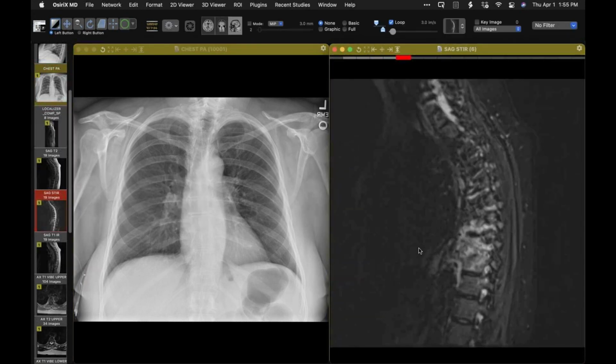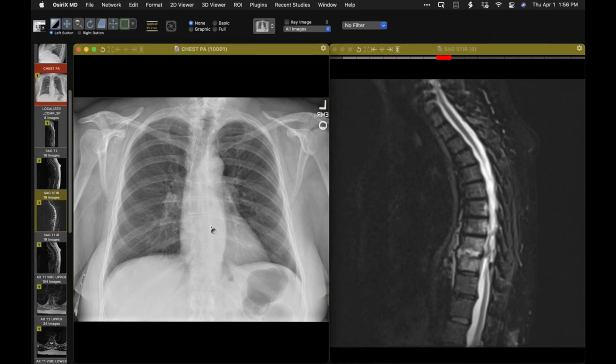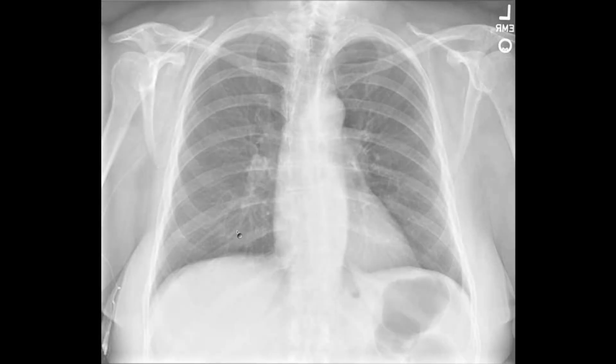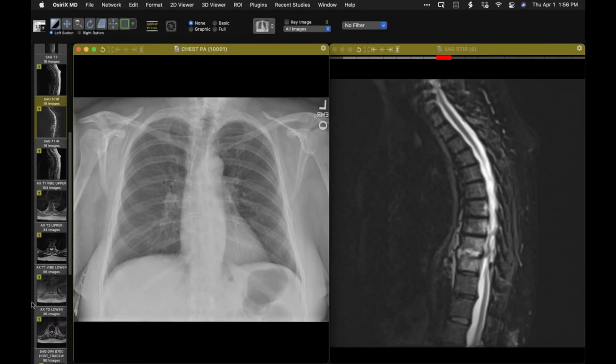And here you can see some of the MR, the abnormality consistent with a discitis at that level and paravertebral soft tissue opacity. So just kind of a satisfaction of search thing, as well as fairly a lot of pathology here. So another focus of infectious discitis with paraspinal abscess, or at least abnormal tissue right there.